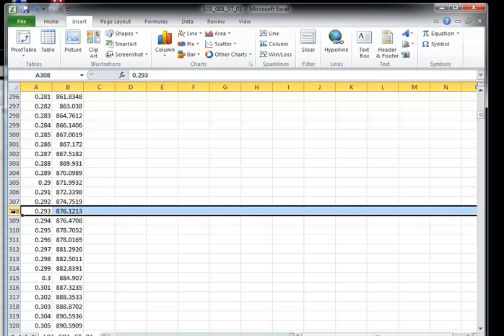Now you could take the baseline off that if you wanted to. You could take it off every value. It depends what it is you're looking for. When we're looking at the rate of development of force, it doesn't matter where we start, because we're looking from the starting point to the end point. So it doesn't matter if we start at 0 or 900, because it's the increase from this point to another point in time that we're really interested in.